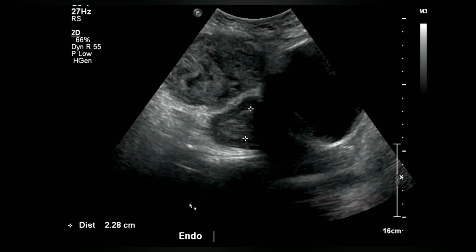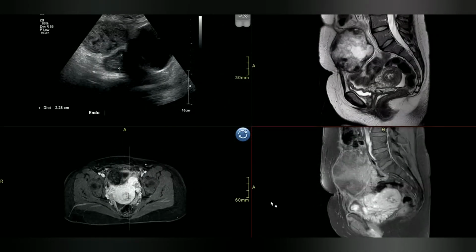Okay. So you have an MR here? I'm on T2 weighted sagittal image. There is an iso-intense area noted superiorly, and there is a hyperintense signal noted within it, and there is a hypointense rim around that, and we are talking about this?